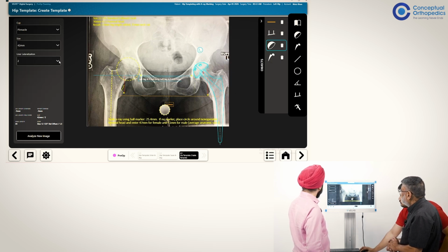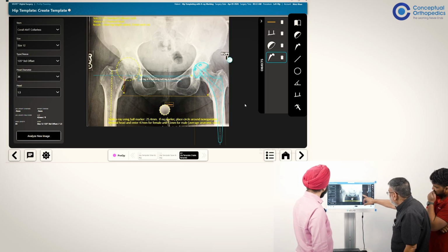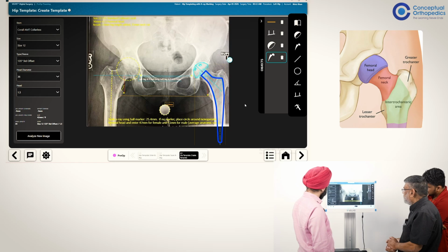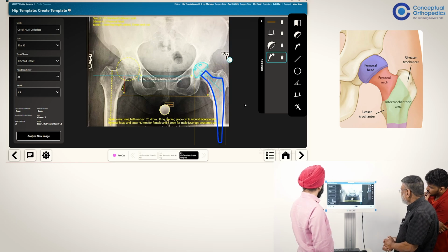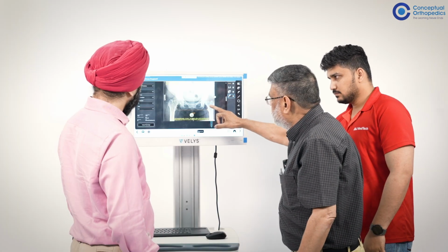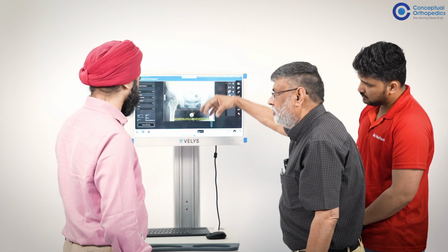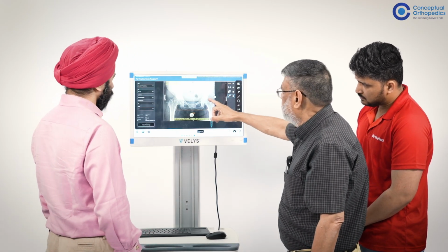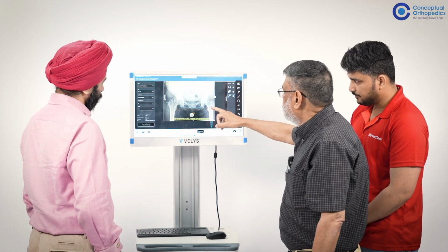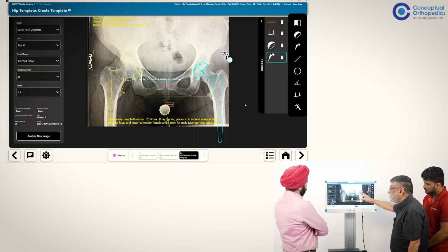So you understand what the femoral and the acetabular side do. From the stem side, there are 3 or 4 options. One is you just want to increase the plus head sizes, which means it will increase in this direction, which will increase both X and Y because it's diagonal. So it will increase offset and the length. Length is for us a good thing, and a little bit of offset increase is not a bad thing.